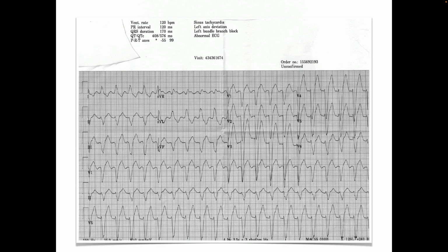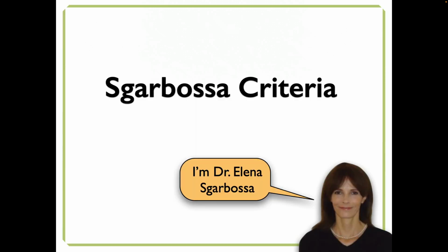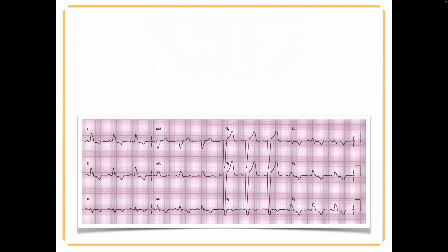Is it supraventricular? Is the QRS wide? Okay, so we're going to talk about Sgarbossa criteria, named for the cardiologist Elena Sgarbossa. Brandon, what is this? No tricks. Yeah, left bundle branch block. Okay.